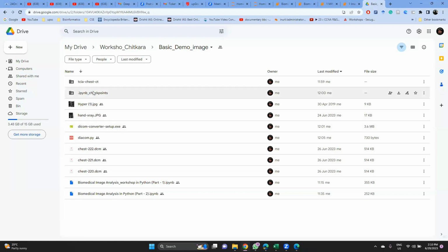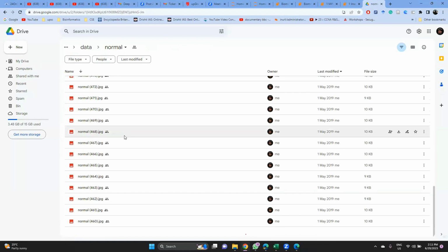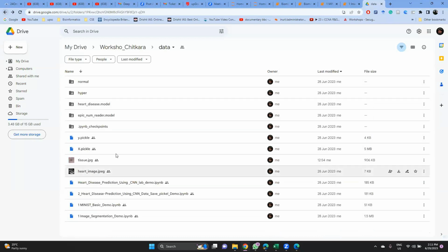For the model which I have trained, the data set I have is approximately 60 GB or 65 GB of data. I have processed that data through a MATLAB code, or through DICOM software also. And this folder contains a small data set. We have images of I think 32,000 total data set of images, but I have incorporated approximately 500 images, because it is not possible to upload all the data over here.